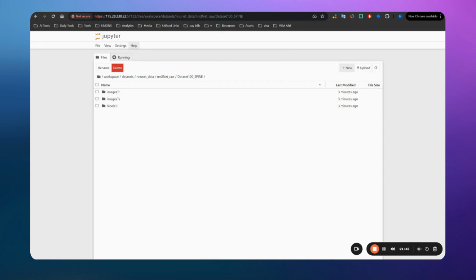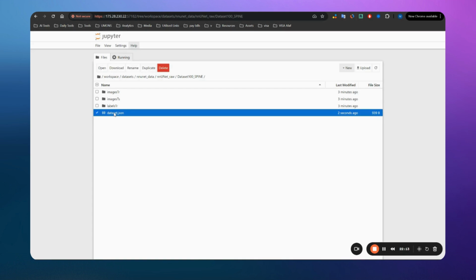So let me see here in my local, coding, spine, utils. Okay, so I have it. I will just upload the file, and I will also leave the file that I use here in the GitHub repository in case you want to use it. You just need to upload it. So this is the file. Why I didn't edit it directly here is because I don't have access to edit a JSON file. I don't know why, but let me just open it.